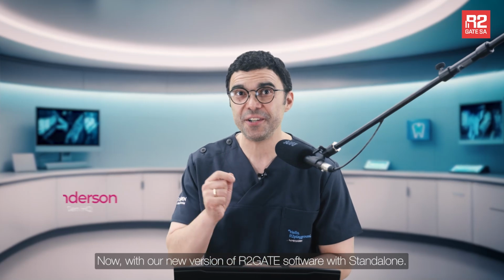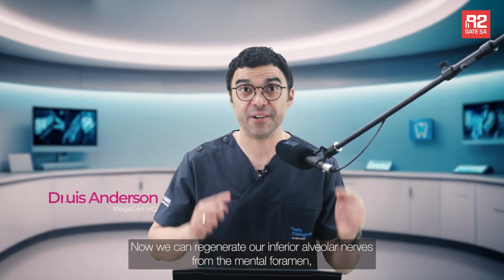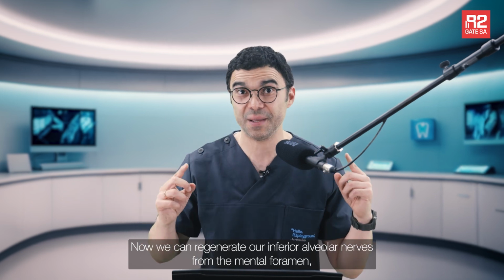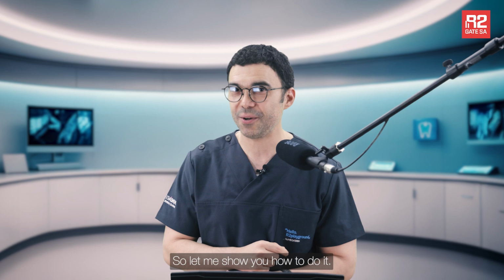Now with our new version of R2GATE software with standalone, we can regenerate our inferior alveolar nerves from the mental foramen in a very predictable way. So let me show you how to do it.